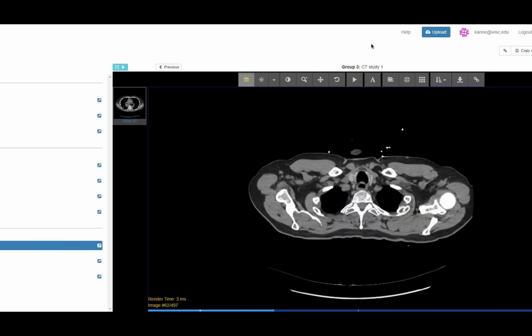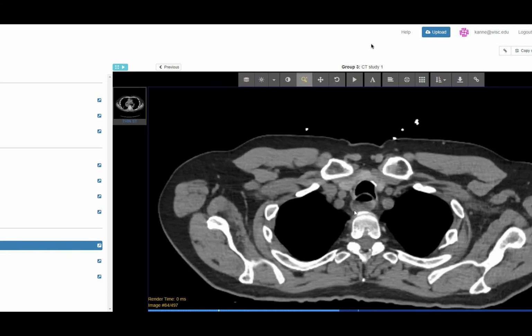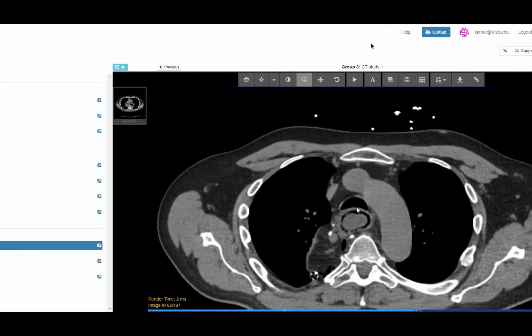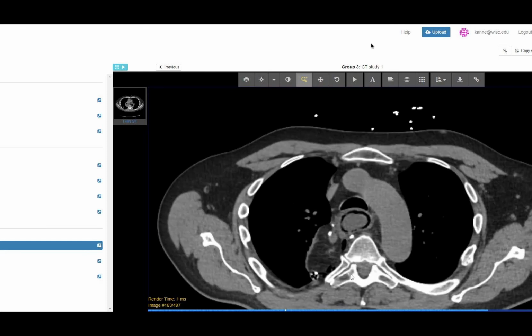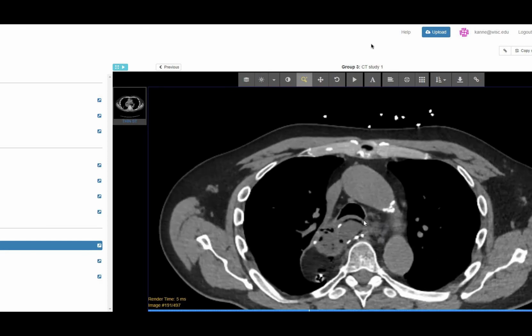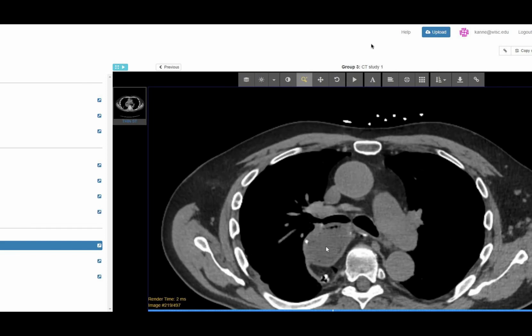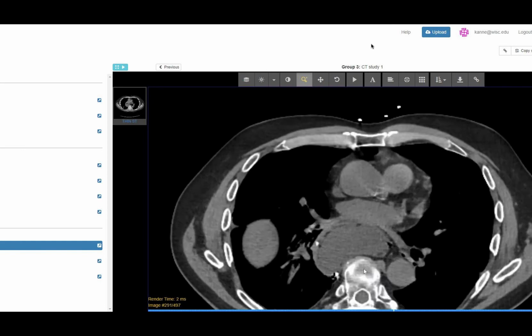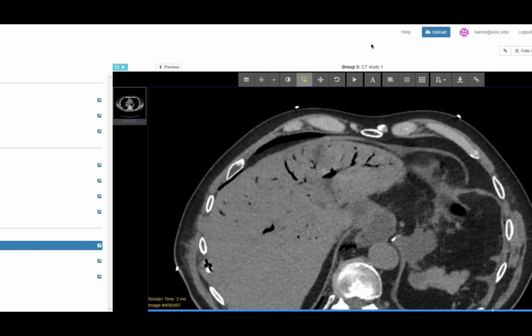They did a chest CT to see what was going on in the chest, and there's the conduit there. But you'll notice there's gas outlining the wall of it. This is the native esophagus here, and this is an Ivor-Lewis esophagectomy, so it's an end-to-side anastomosis. Then as I go down, there is pneumatosis in the conduit. There's your portal venous gas, which is quite pronounced.